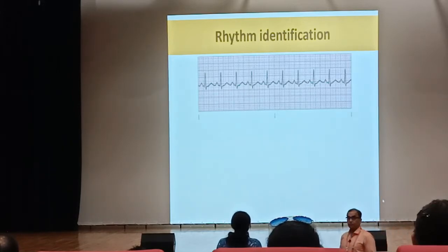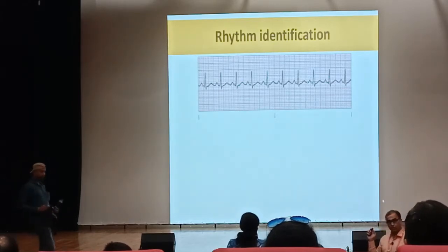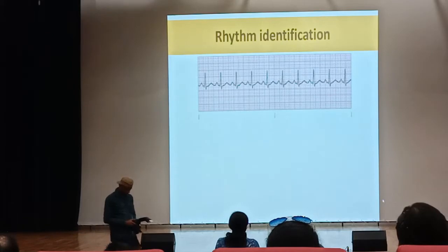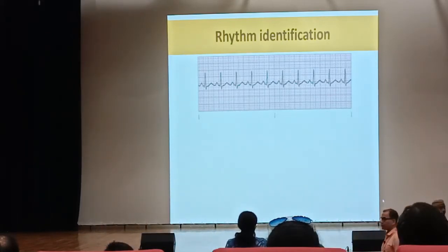Then you look at third, what is the morphology of the P wave? Morphology looks similar. We look at this P wave, all are similar. Okay. Then what next? We look at PR interval. So is it normal? Yes, sir, normal. PR looks normal. What about the QRS complex?